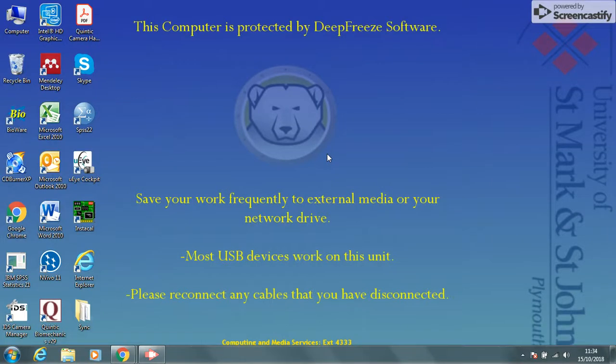So this video is just going to run through how we can synchronize video footage within the Quintic software with that derived from an external device such as a force plate. Before we go ahead and try and synchronize, we need to make sure that all of the data files are stored within the same folder.